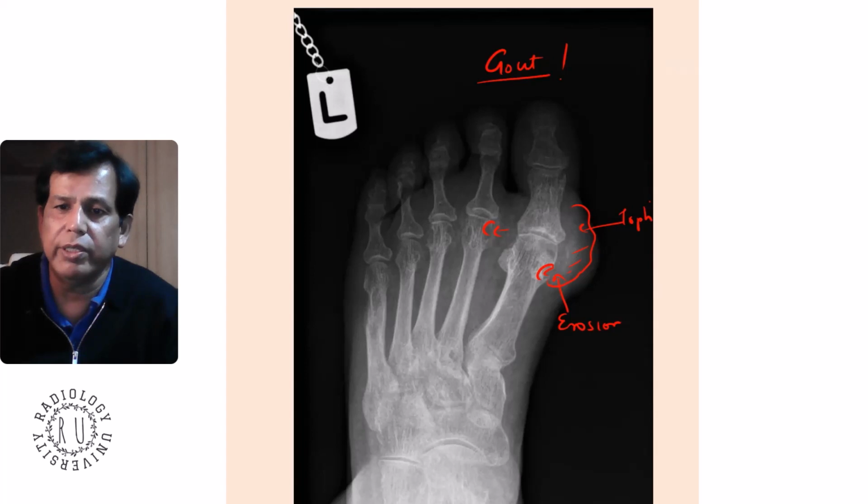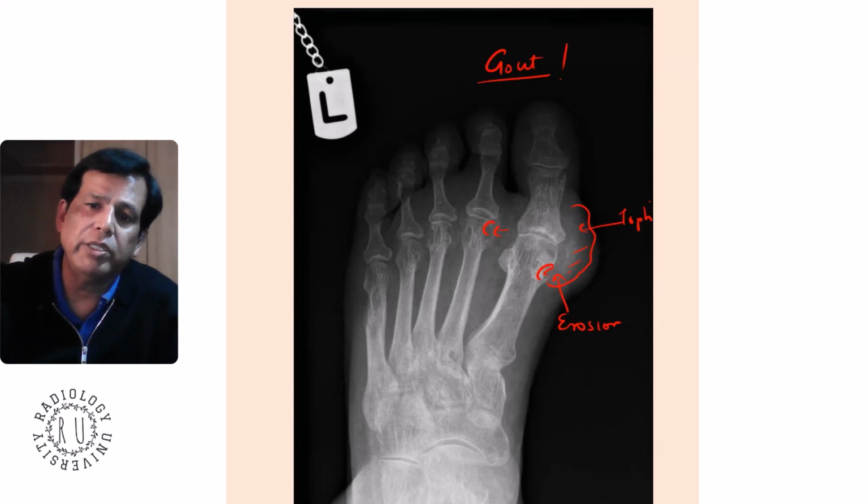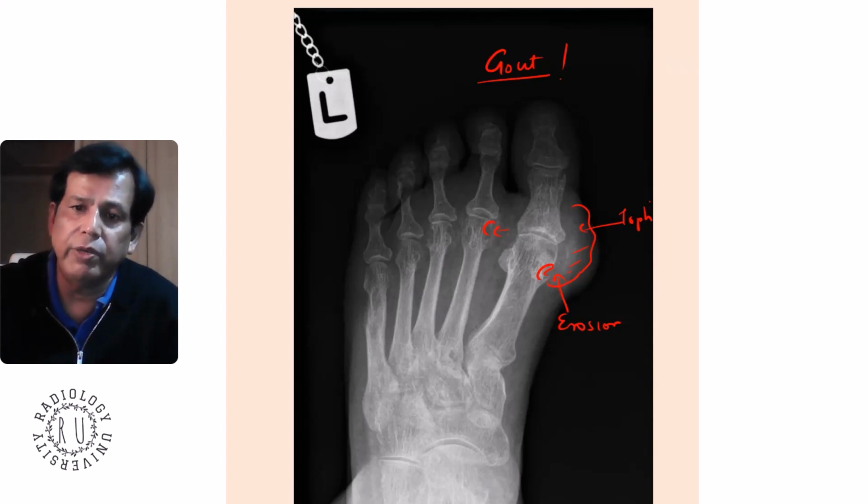I think now you know exactly what we're talking about. We saw PVNS, we saw gout. So we've got 6 cases so far with normal joint space and erosions. We are very confident this is gout. You can even say that there are punched out erosions here. Gout will involve mono or poly, but gout is very notorious for the great toe.